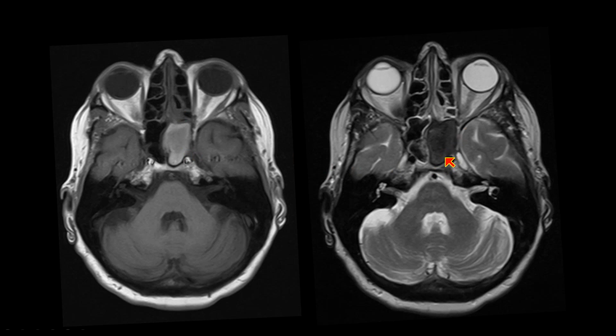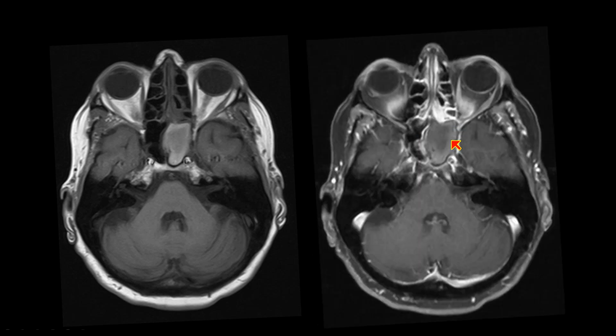This is very dark T2 signal, and fungal disease is one of those things that may be very dark on T2. It might look like an aerated sinus, but it's actually opacified. And if we had paid close attention to the post-contrasted imaging on this patient, we see that the other sinuses are actually enhancing, but this sphenoid sinus is not enhancing inside of that air cell. So this is actually fungal disease that went from the sinus into the cavernous sinus adjacent to it. So that was actually a fungal aneurysm.